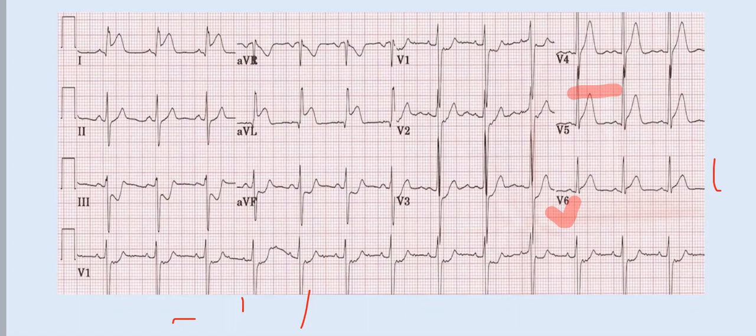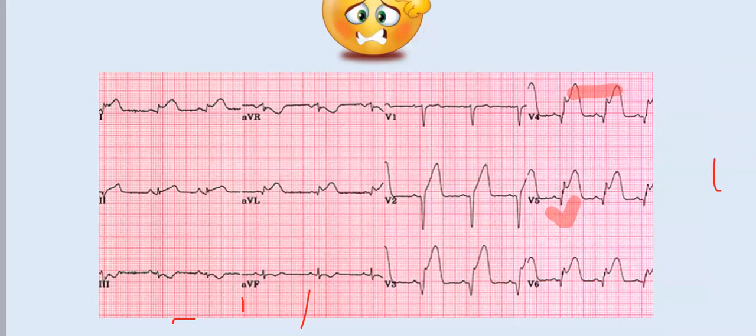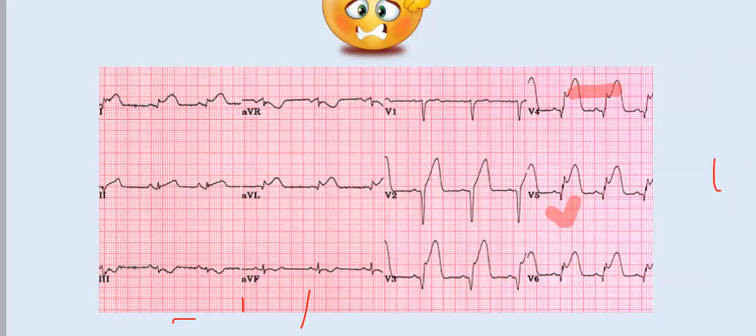Okay. طيب, now what do I see here? What is this? Descriptively, what do you see? In terms of ST segment elevation, where do you see that? ST segment elevation. Anterolateral. I see it in V1, V2, 3, 4, 5, 6, 1 AVL, 2 and AVL. In 2 as well. Do you see it in 2? Yes, kind of. So what is this?